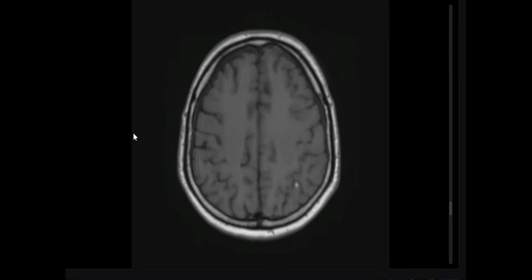I put it as a differential if there is any associated dermoid rupture, but I think it's away from our context. Yes, good. Blood first. Okay, sorry.